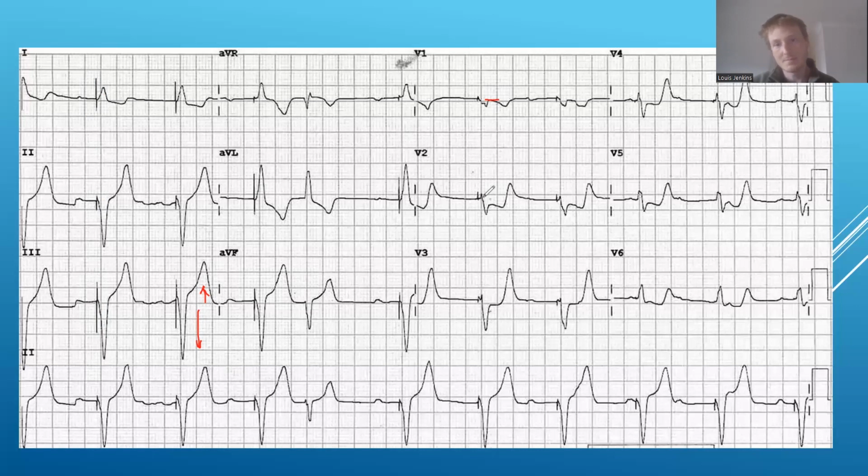V2, discordant, and we have a lot of ST depression, but we'll come back to this. This does look strange though. Similar thing in V3. Similar again in V4. Okay, and now we are in V5. And this is where I'd say it's a little borderline, but I'd say that we do have some concordance here because the QRS is kind of isoelectric, but they're more or less pointing in the same direction. We do have some quite marked ST depression.